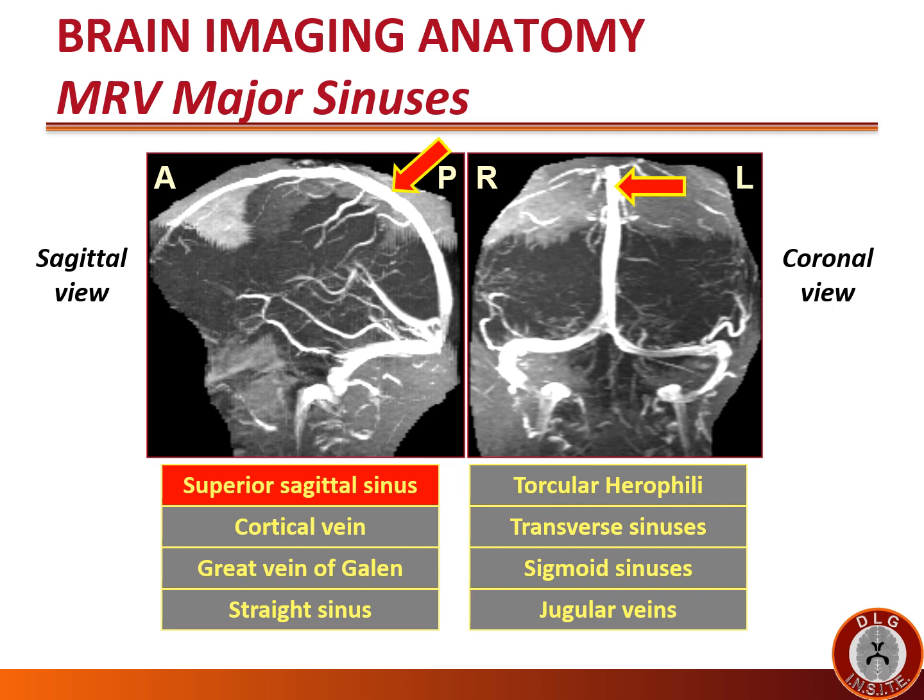The superior sagittal sinus is midline and forms in the folds of the falx or dura at the top of the head. Blood flows posteriorly, from anterior to posterior, and the blood from the superior sagittal sinus drains into the torcular herophili.